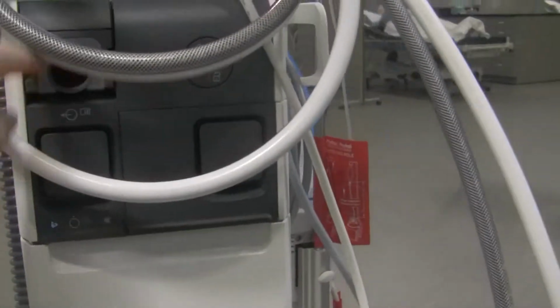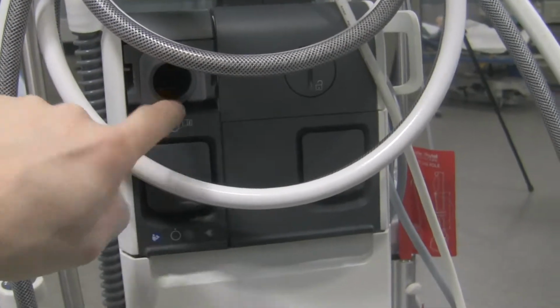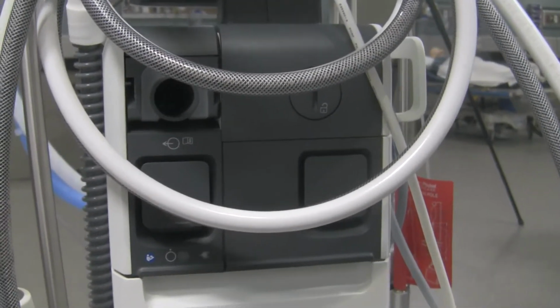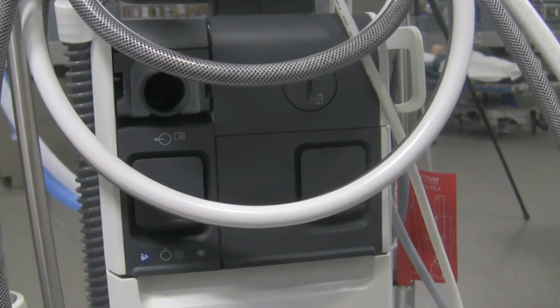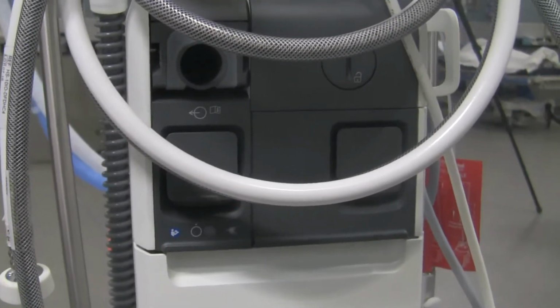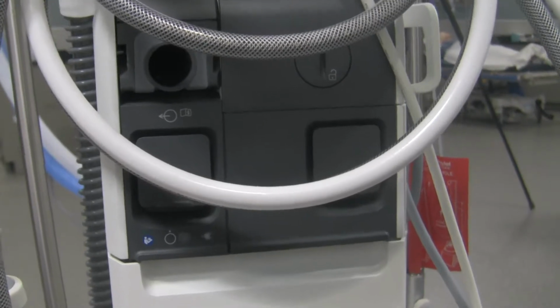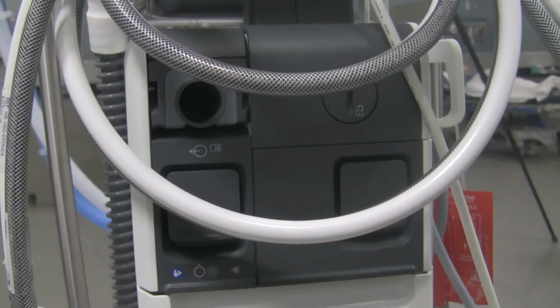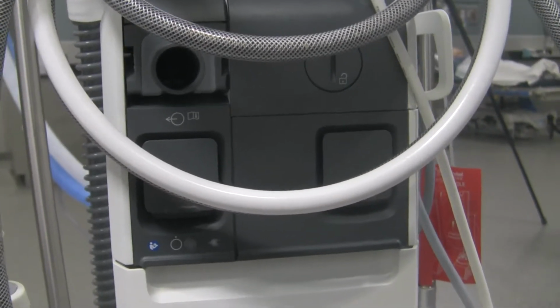Now on the back of the unit, not too much. This is where the gas comes out of the unit, right over here, before it goes into the atmosphere. And again, it's filtered before it comes out. The types of filters you might have on your ventilators could be slightly different from the manufacturers, but also even within the hospitals that you work, depending on the severity of your patient and any kind of infection control procedures or precautions you might have in place.